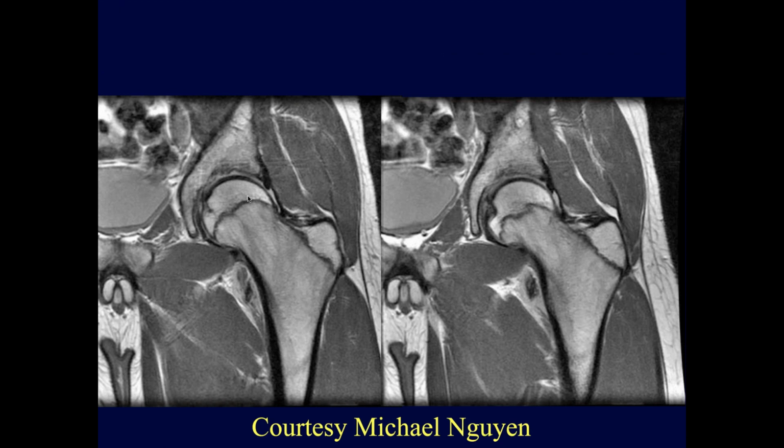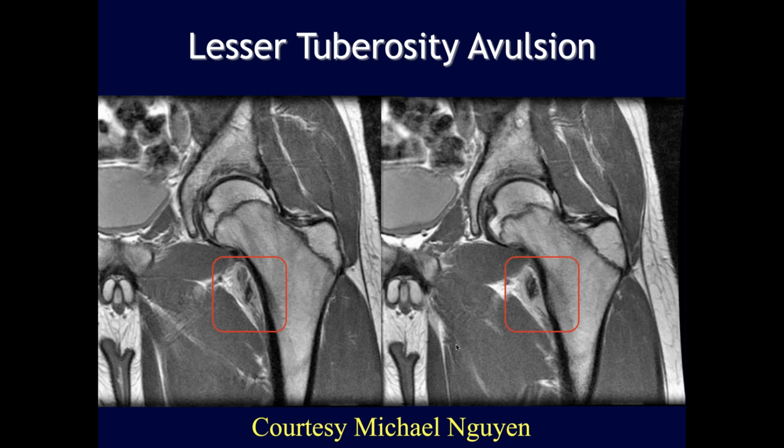So I think the finding we're looking at is right there along the medial aspect of the proximal femur, kind of where the lesser trochanter should be. And I don't know if it's just because we're not cut through, but I don't see a lesser trochanter, so I wonder if it's been injured previously. Yeah. Oh, sorry. Yeah, lesser tuberosity.